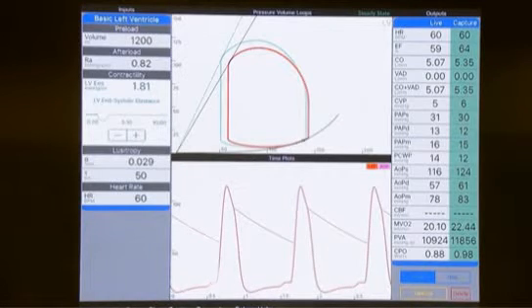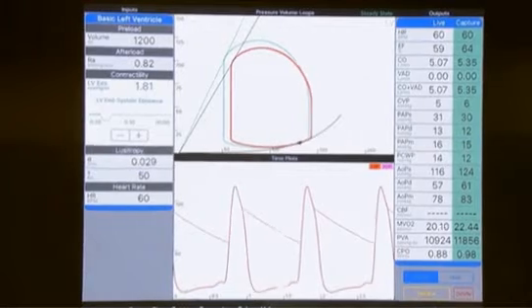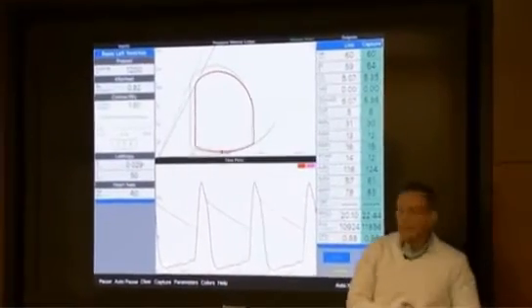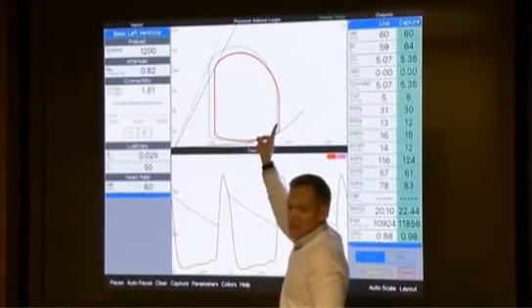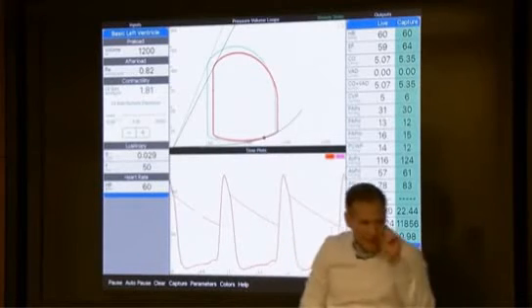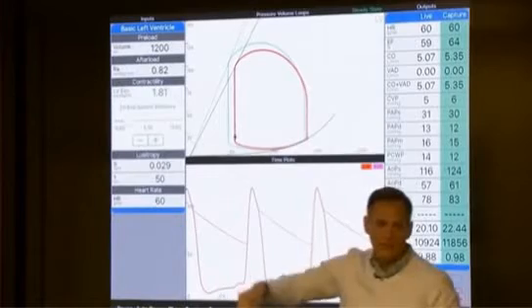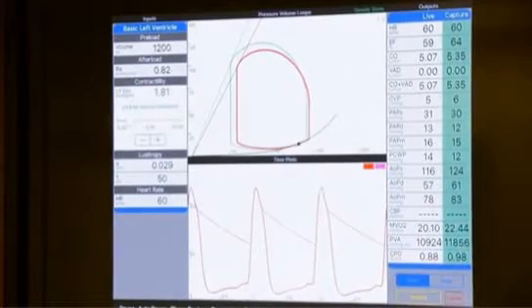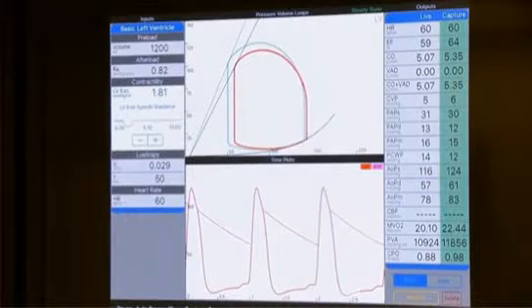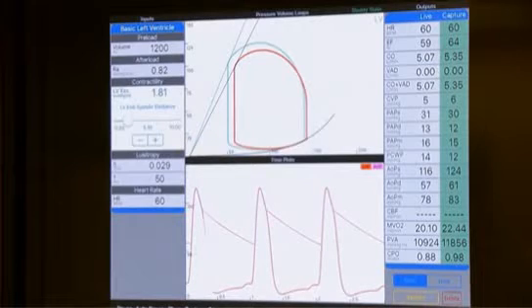The width of the loop is stroke volume. Stroke volume is related to cardiac output, right? Less, and it's a narrower loop. So stroke volume went down, i.e. cardiac output went down. And then EF is the stroke volume divided by the end diastolic volume. The end diastolic volume, although you see a slight change there, it's not much. So the stroke volume reduction led to an EF reduction, all right? So that's a change in contractility that we just did mathematically, purely changing the numbers in the simulation.